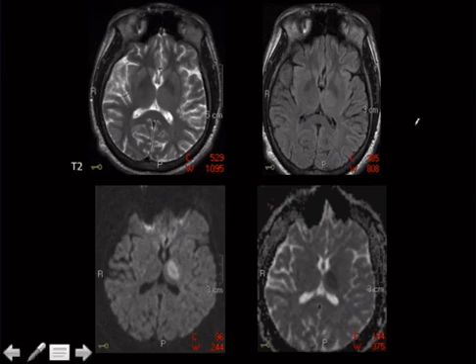let's see. We've got CSF is dark, so that's T... what? That's not T1. Almost said T1. Did you almost say T1? If you did, that was wrong. This is FLAIR. Well, how do I know it's FLAIR? CSF is dark. You have to look at the white matter.